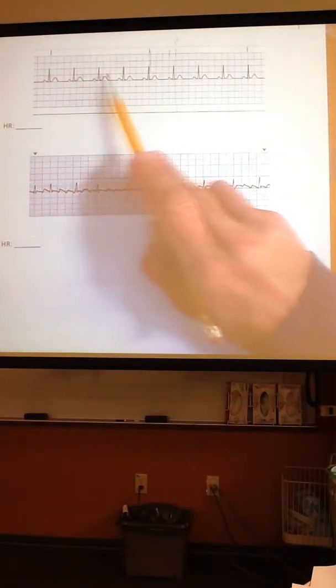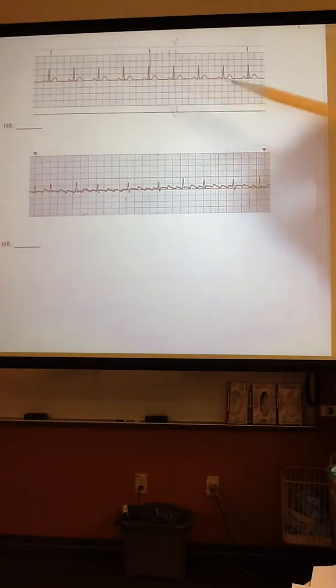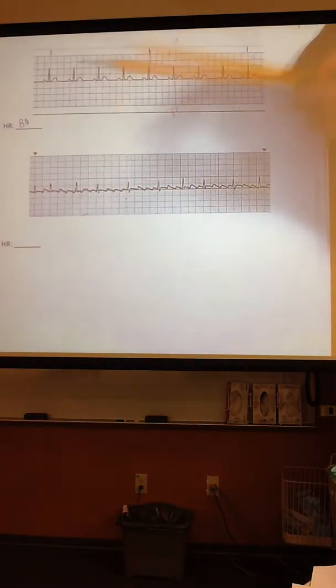Sometimes you'll also see the spaces counted. I believe the undergraduate textbook says to count the spaces, but in the end you get a heart rate that's pretty close. So we are saying our heart rate is 80. Now let's come down here.